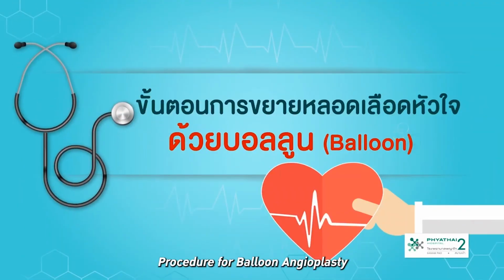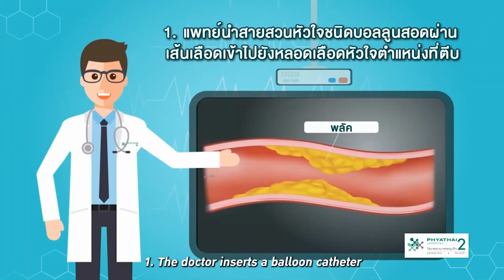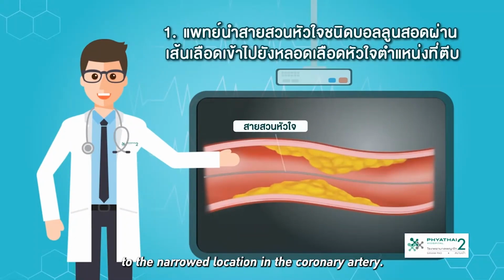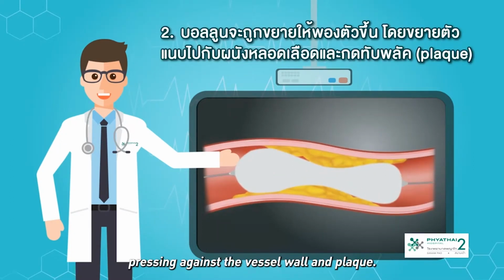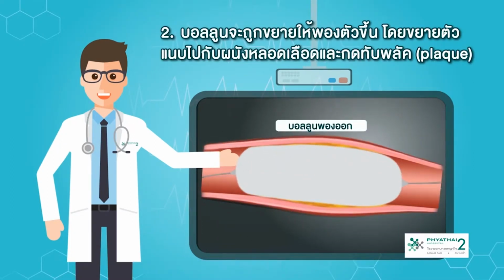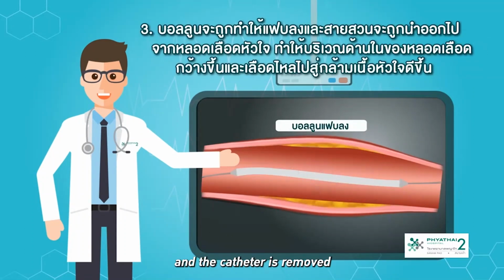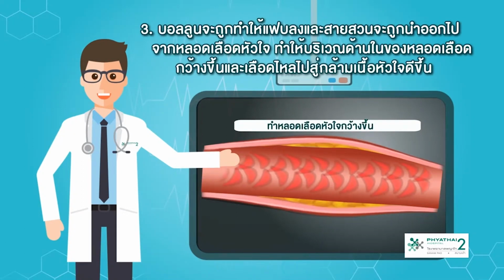Procedure for balloon angioplasty. 1. The doctor inserts a balloon catheter through the blood vessel to the narrow location in the coronary artery. 2. The balloon is inflated, pressing against the vessel wall and plaque. 3. The balloon is deflated, and the catheter is removed, improving blood flow to the heart muscle by widening the vessel.